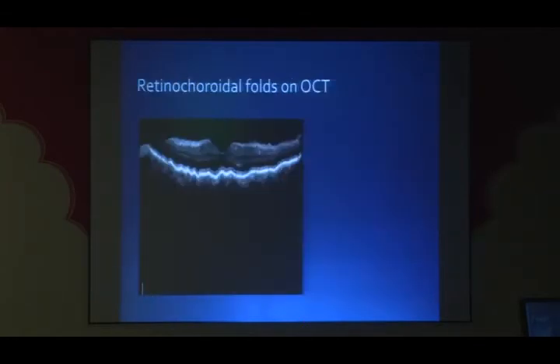And this was the OCT picture, retinochoroidal folds on OCT. This is something which we had never seen in a patient with striae, with history of viral fever and presenting with a post-neuroretinitis like picture. So this was something that we saw for the first time, and I would like feedback from the audience and the panel if there is time. This patient unfortunately was lost to the viral disease and its complications.